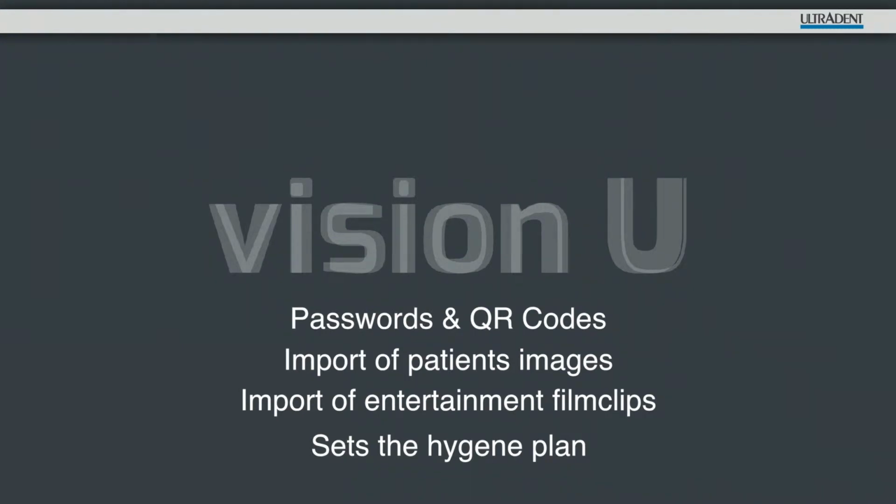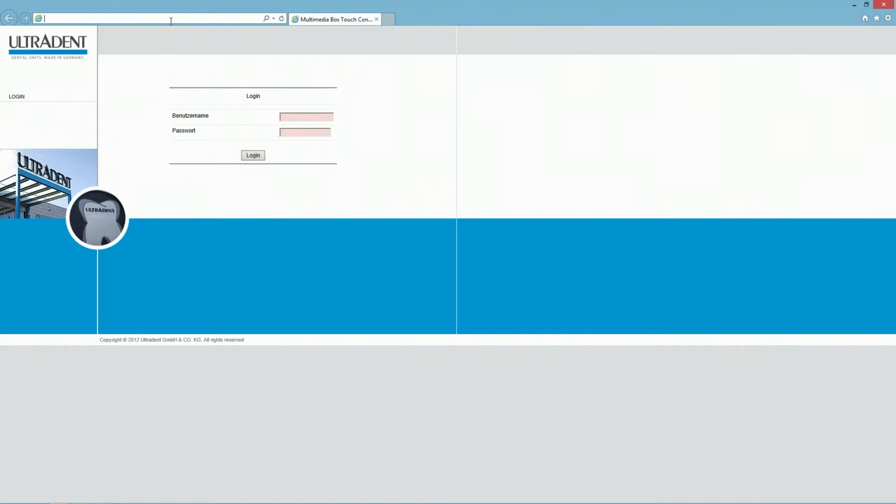To access the application, open an internet browser on any PC in your practice network. Enter the IP address of your system in VisionU. Now a user interface opens that prompts you to enter your password. The factory setting for user is Ultradent and for password Ultradent. These can be changed as desired.